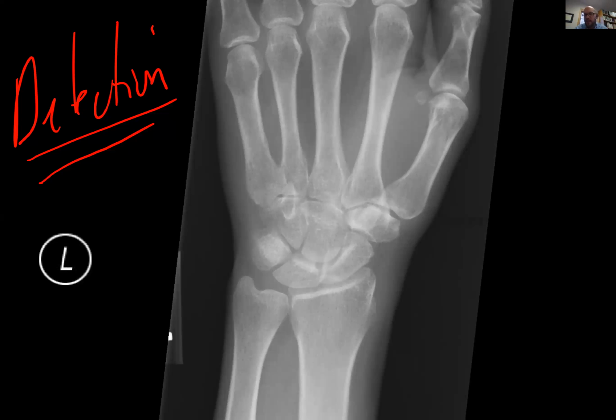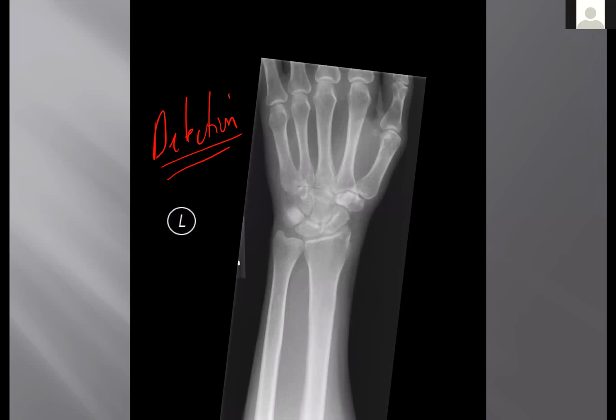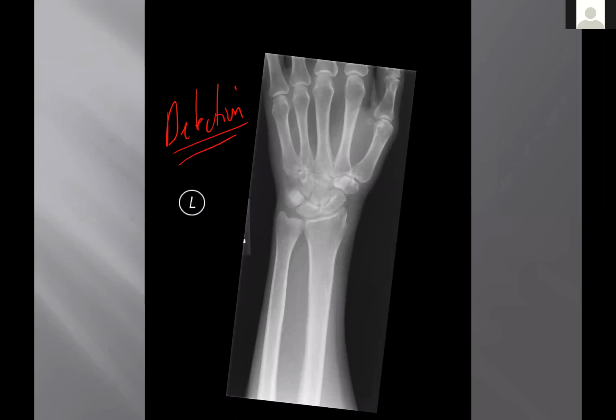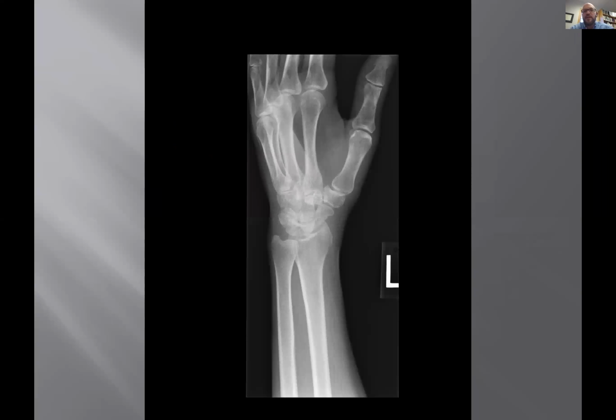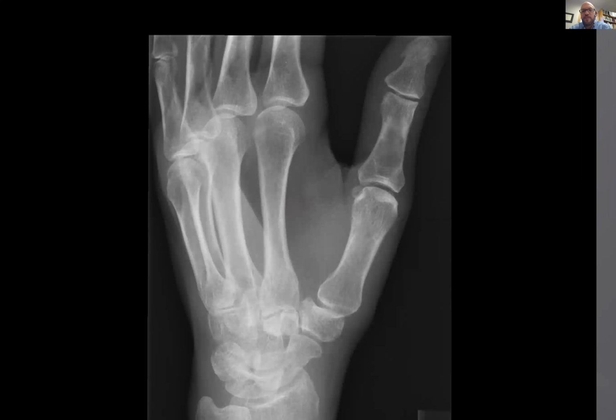And here's another view, and I think the other view is a little bit even easier to see. There we go. Let me make this. There. See what I'm seeing now? Yeah. So, okay, good. So what is the most common, okay, this is a quiz question.